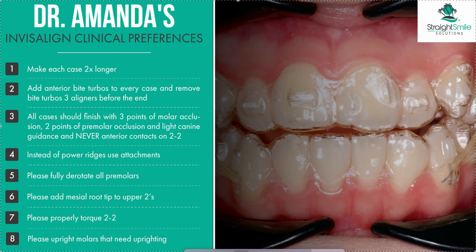Now, not all of these are, quote, global clinical preferences. That means I don't always stick them all in my actual clinical preferences because I can't use them all in every single case. I'm going to go over these line by line, and I might give you a few more as well. I want to go over what cases you could use them for and which you can't.